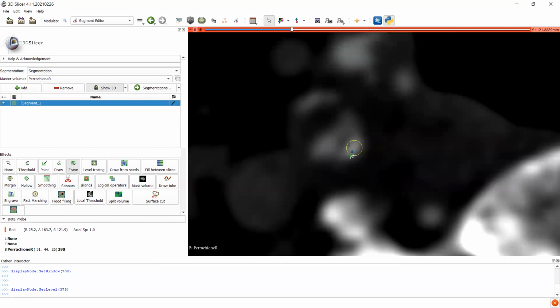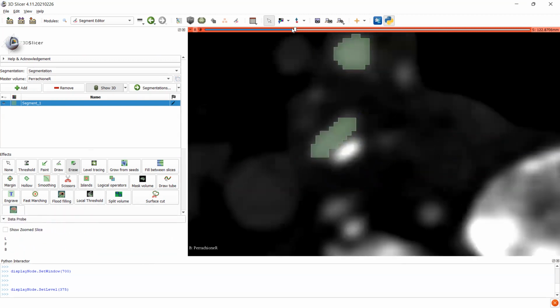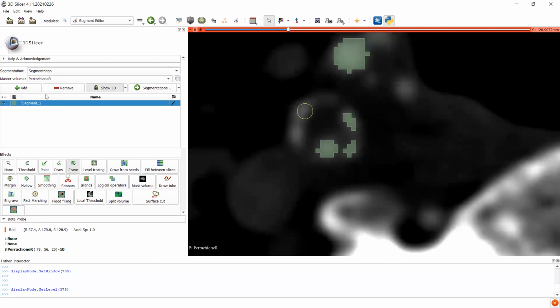And again, the plaque is kind of dying down, but you can see some clotting right here too. You still don't want to include that. And even right here, this is a little bit too light to be flow lumen, so I'm not going to include that either. That's pretty consistent with the rest.